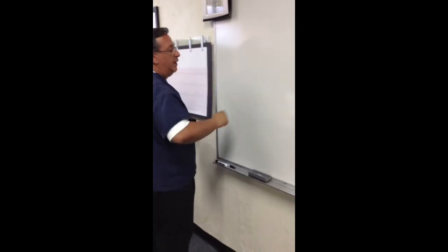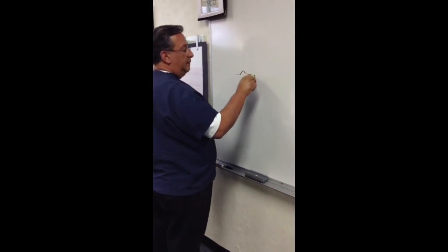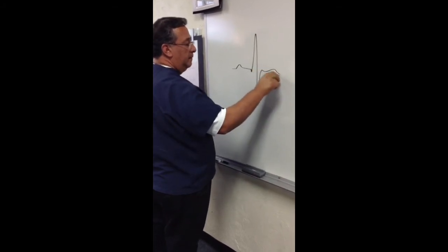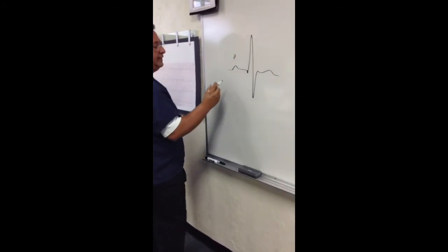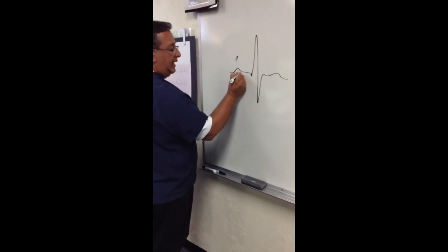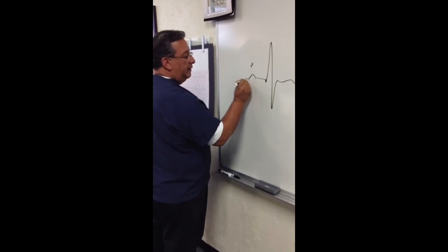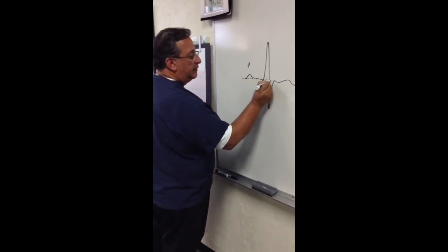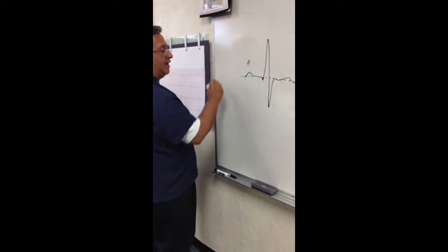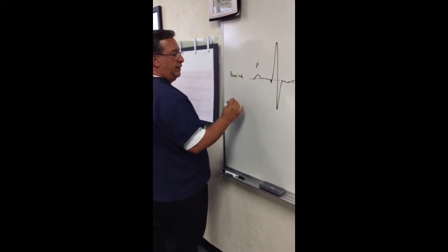You have a handout that tells you how to measure your P wave. Remember, it says to measure from the beginning of the P wave to the ending of the P wave. In other words, where the baseline, remember, is that imaginary line that goes across the tracing.